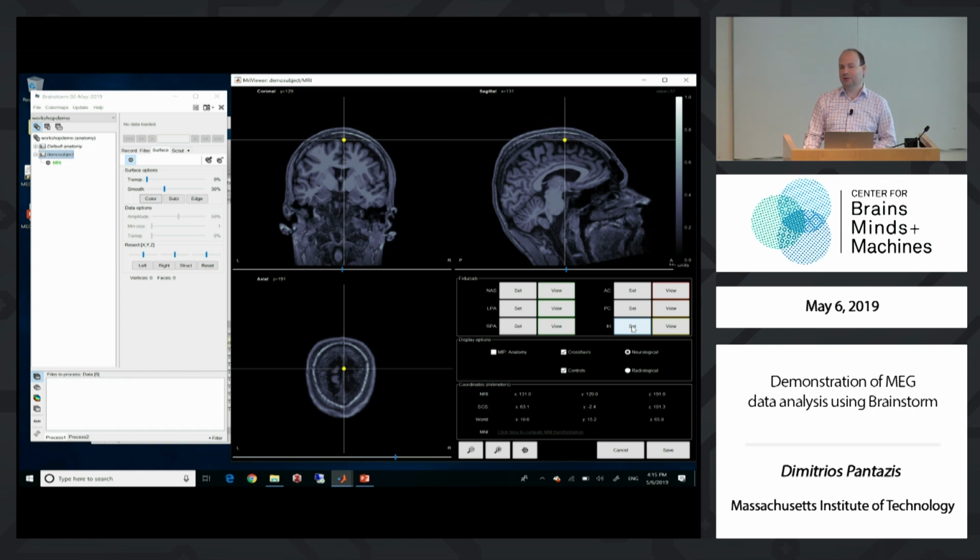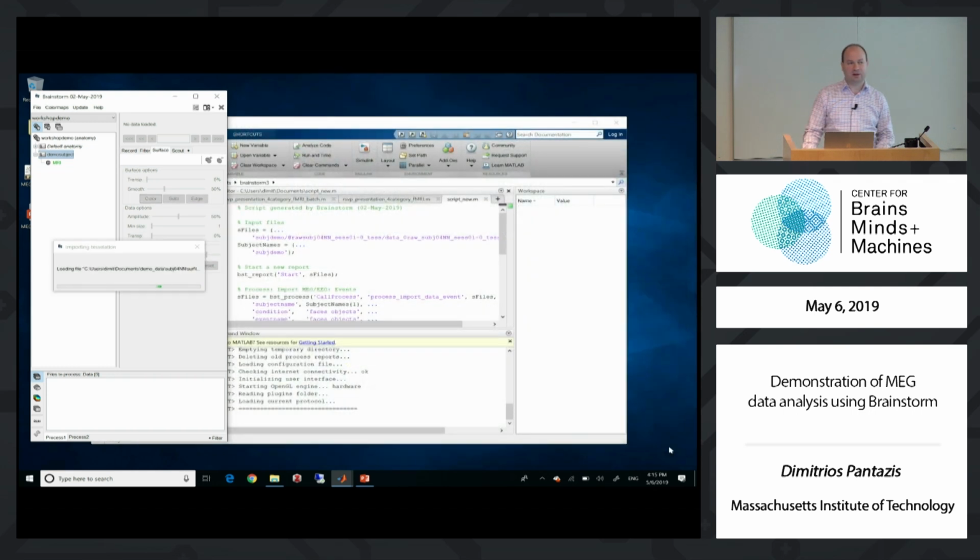And then after I selected these 6 points, I can save these points, and then this will trigger the remaining importation of the anatomy in the Brainstorm software. You will see progressively the messages importing the different surface files, the left pial surface, the white matter surfaces, left and right hemisphere, anatomy volumes, labels, and so on.